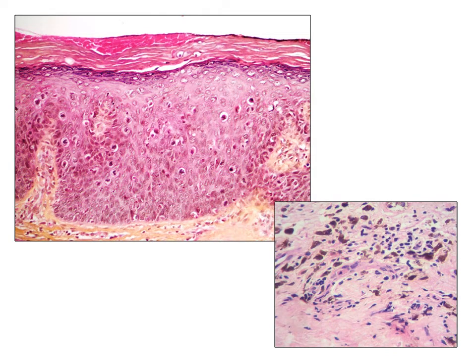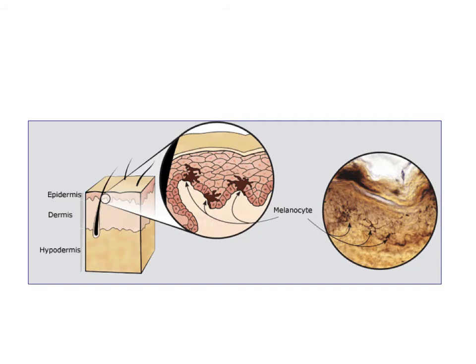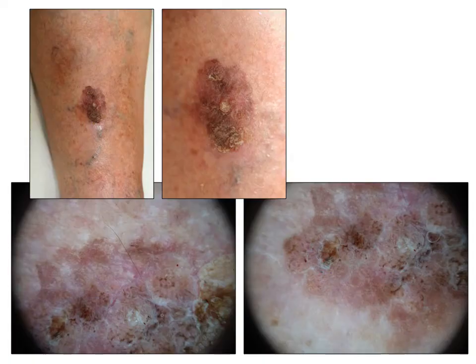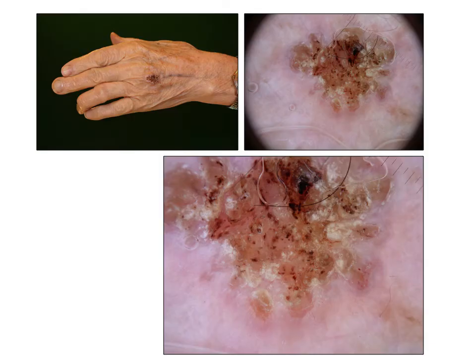In squamous cell carcinoma, one can see some pigmentation. This pigmentation could be due to melanin, and this is often the case in Bowen's disease. But some of the pigmentation observed in squamous cell carcinoma is due to hemoglobin in purpura. And this purpura is often observed in the central plugs of keratin seen in thick squamous cell carcinoma.